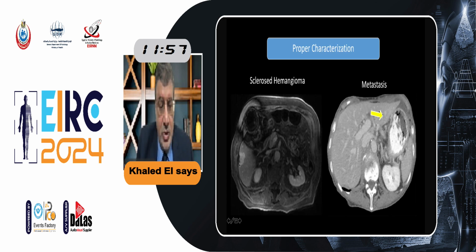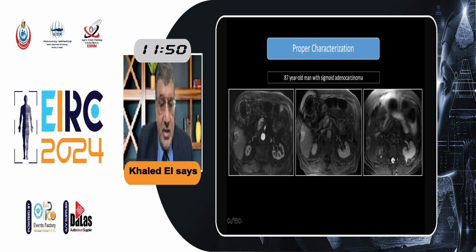It's sclerosing hemangioma. I see why this was misinterpreted, because if we go back to the case, it doesn't demonstrate the routine typical imaging features of hemangioma. It rather has a continuous rim of enhancement, capsule retraction, and complete enhancement. So this fits hemangioma, but these other characteristics do not fit the characteristic of hemangioma. Those are continuous rim of enhancement with capsular retraction, right?